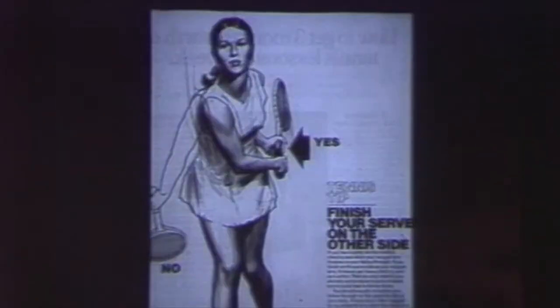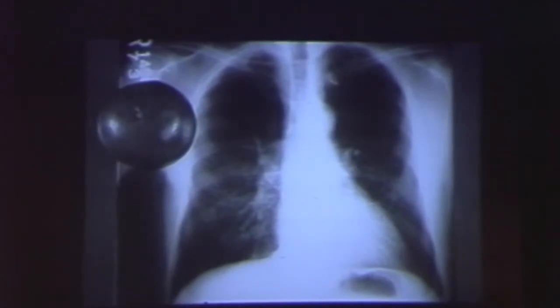Remember, though, that you have to, for a good serve, finish on the other side. Be sure and finish the other side, starting low and finishing high, and there's this patient's tumor nodule.